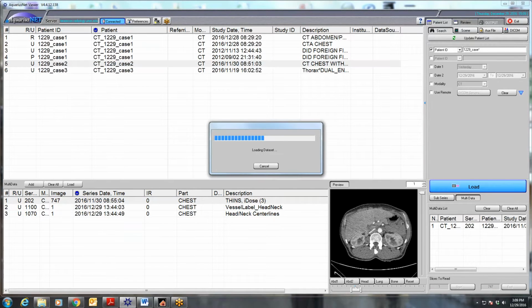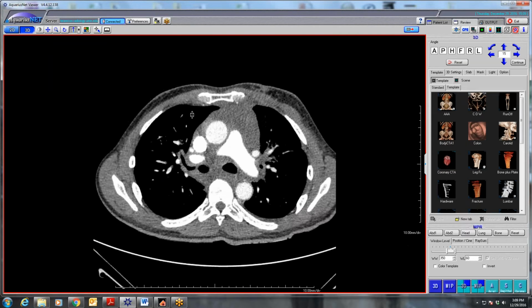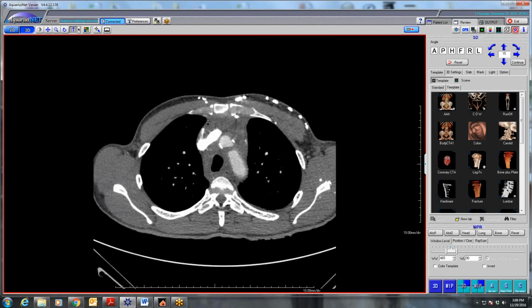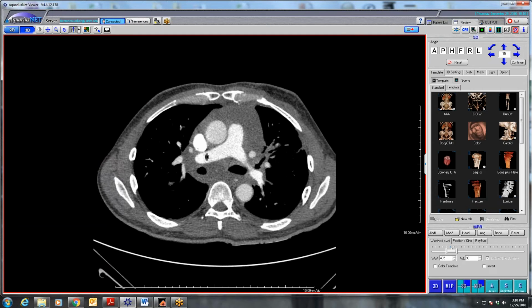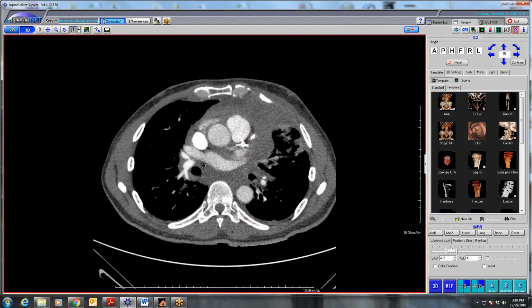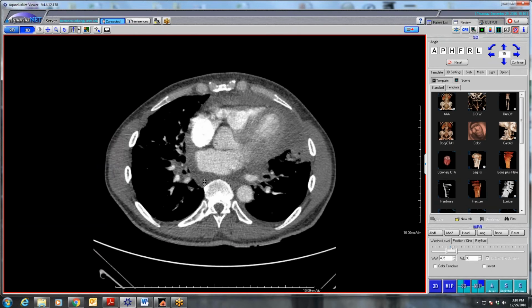So this one, I can never remember what it's called, but it's pretty characteristic. This is a guy who has been here for some time. He has a known diagnosis of this mediastinal, this is not proven yet, although it kind of is proven, this diagnosis of this kind of infiltrative mediastinal mass. It's surrounding everything. It's really not pinching anything off.